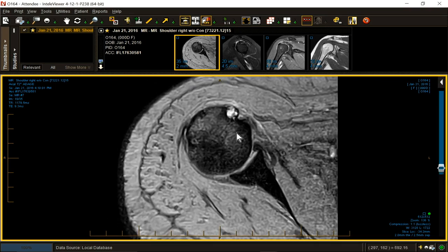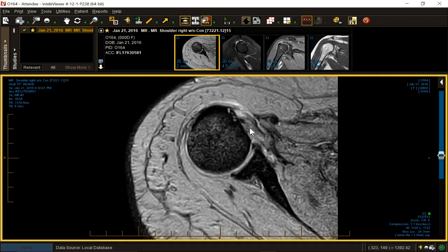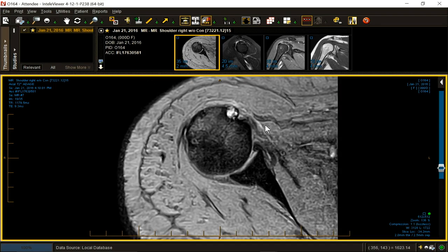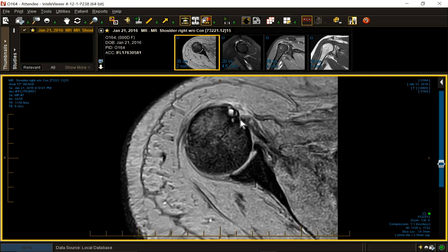There's a little bit more going on. There is a pseudocyst of the lateral wall of the bicipital groove, and usually those pseudocysts arise because there is a problem with the biceps pulley mechanism. Sometimes it's a result of a tug phenomenon from the transverse ligament and the subscapularis fibers. Occasionally it's from internal rotation and abutment against the coracoid. But that will not be the focus of this case. And admittedly, the biceps is tendinopathic and diseased. But let's focus on the cuff.